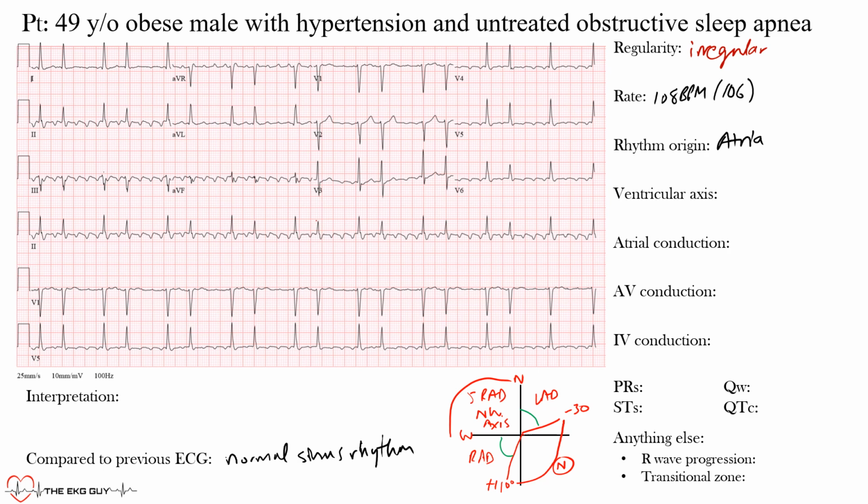Not too many things hang out there, but you may see VTAC, so ventricular tachycardia. That's one of the features that you can see occurring there. In fact, there was a recent published article that showed that, which didn't seem too novel, but they reported it as novel anyways. That's beside the fact. So let's find the axis here.